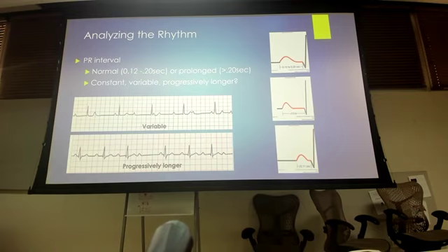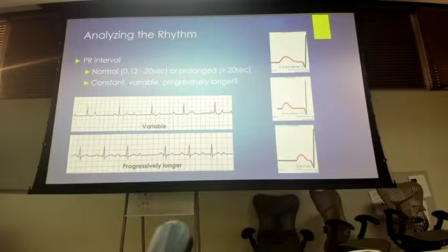In this top picture, does everybody agree that this is a P wave? Right here, P, QRS. Does everybody agree that this is a T wave? What do we have here?